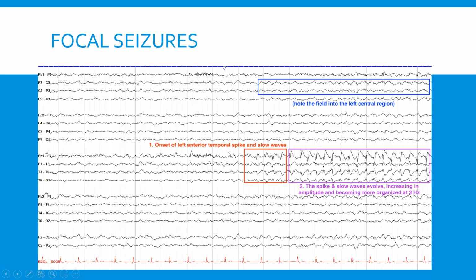So this is how a seizure should start. It should not just start out of the blue and not change. It has to have a ramp up. The seizures have to ramp up in this way. The amplitude gets higher and higher.